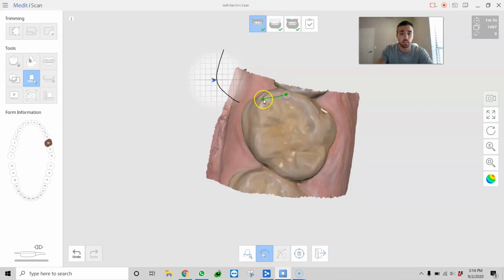With this, I'm just simply left clicking and I'm just drawing around my margin, just like this. Now, the more points you give it, the better. I wouldn't recommend going this far across because the line is going to lose track. So we recommend doing multiple little dots. And then when you reach here at the end, when you connect it back to your margin, it'll turn purple. Double click and it closes it.